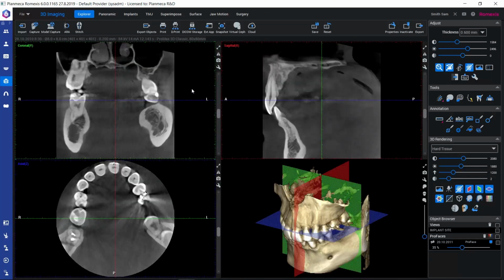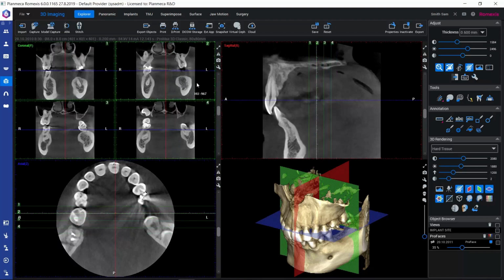We can have several views available of any of these slice views. So if we open this small wrench-like icon here, viewport settings, we can find a grid with which we can specify how many slices we have visible. So if we hover our mouse on top of this grid and select an appropriate number of slices, we can just click on that with our mouse, and we get, for example, these 4 views. Like we see, each of the view is indicated by a number, so that we can better understand in the other slice views which view is which.